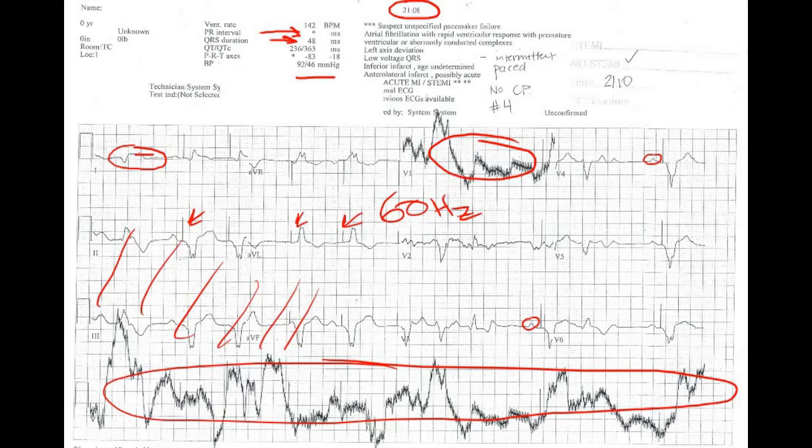The cable might be next to a piece of equipment. They might have taken their remote control for the TV and the nurse call button and set it down on their chest right on top of that V1. But that's some interference, and if I saw this on a 12 lead on a patient that had been showing VTAC and STEMI, I certainly would reshoot this right away to get a nice clean 12 lead.